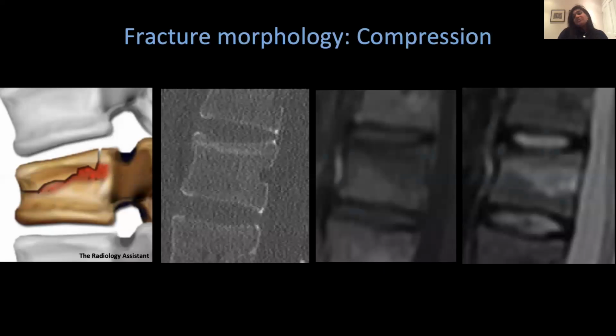So the most simple type of fracture is the simple compression fracture. This usually results from an axial loading force on a flexed spine, and you get an anterior column failure at 1 or more levels. And it tends to be a pretty stable fracture, because we've only really involved the anterior column. So you often get an anterior vertebral body wedging, there may be a cortical step break like here, you may see a horizontal sclerotic line parallel to the superior end plate, and that's due to the trabecular impaction of bone. You may see a fracture of the superior end plate, less commonly the inferior end plate.